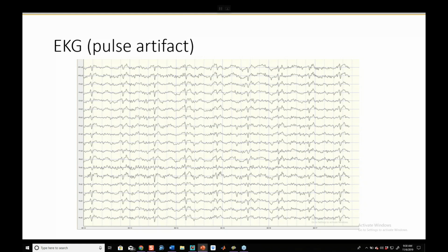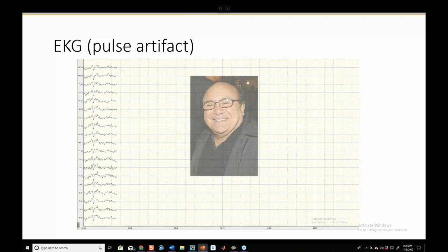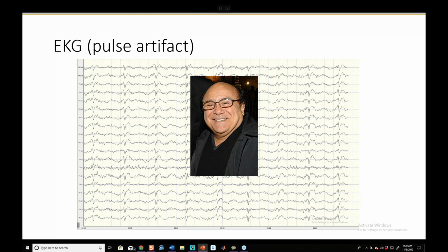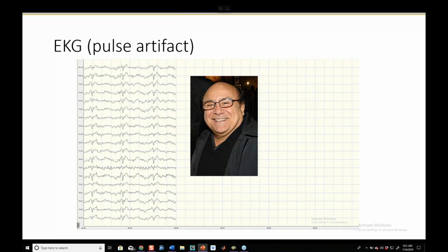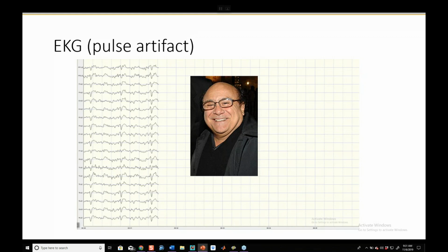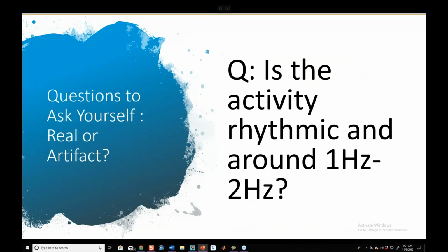And so this is really sneaky, because now when we eyeball EEG, even if we have only linked ears, you can often trace where the bad guy is simply by finding out where he's not showing his face in the EEG, right? That's the one that's going to be closest to the contaminated ear electrode. So you would find this type of artifact in someone like a Danny DeVito, someone with a squat neck, a neck that kind of like moves right up into the head. Sometimes you just can't get away from it. You could, however, switch to an average montage and do better.